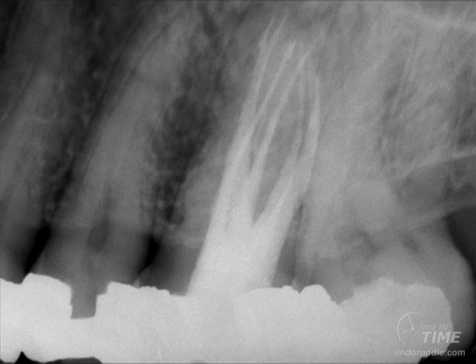What's the point? The point is, when we talk about the rationale for treatment, of course, after diagnosis, the most important step would be the first step, and that's access. And we need complete access, and I'm really trying to emphasize today to have aboard the technology that allows you to see well and visualize pulpal floor anatomy.